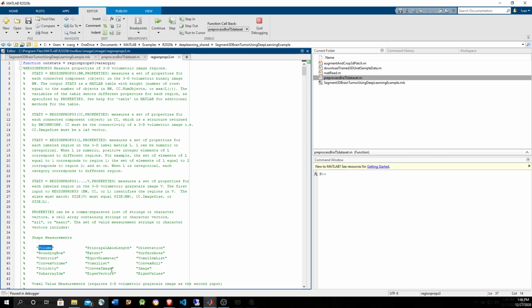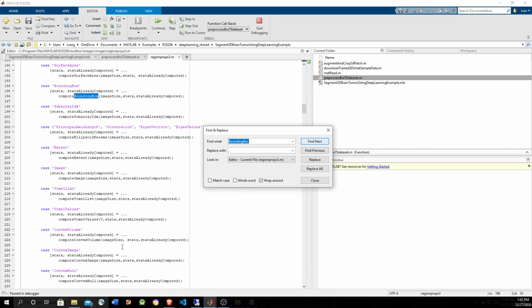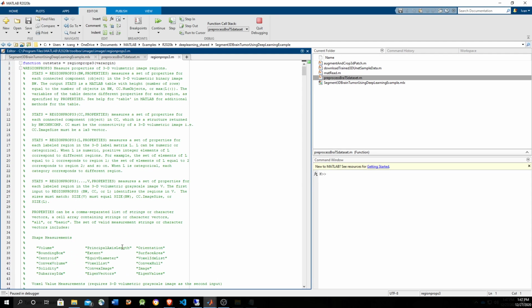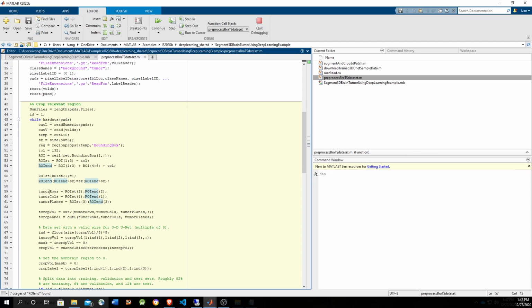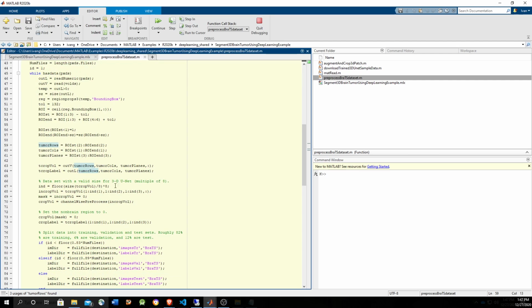Also, we have a bounding box, which is the property that we are using here. This bounding box is going to be used to capture the actual image, and then once you have that region, we're going to clamp it. We're going to put it as a region of interest, and basically we're going to filter some pixels out.